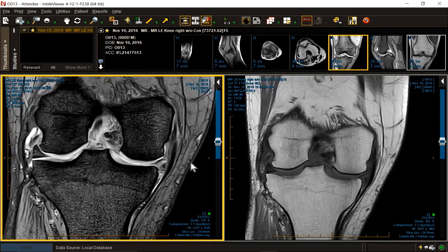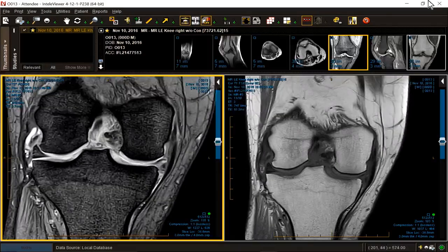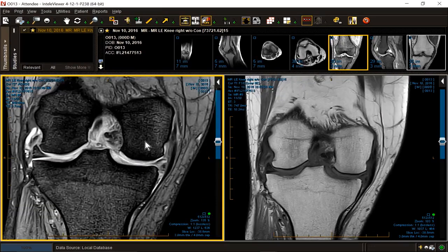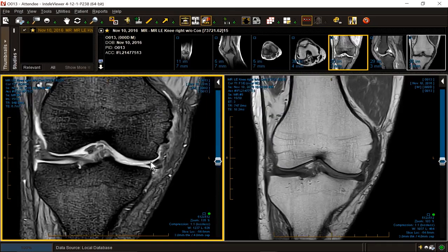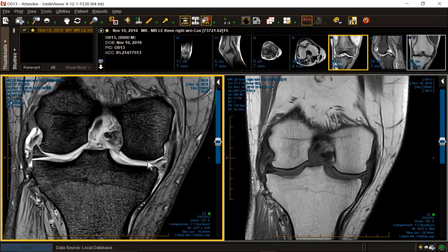Meniscus is no longer a functioning structure, and it has a thick, much thicker than the other side, complex pattern of flap tear associated with it. So how might I describe this? Medial compartment failure with medial femorotibial shift, diffuse class 2 to 3 chondromalacia punctuated by meniscal failure. The meniscal failure is greater than the chondral failure. Punctuated by meniscal failure with a large 3 to 4 centimeter complex flap tear and meniscal extrusion. That would be my conclusion.